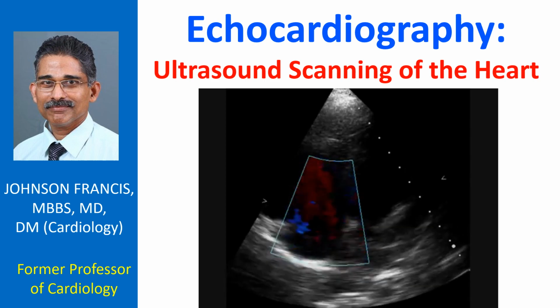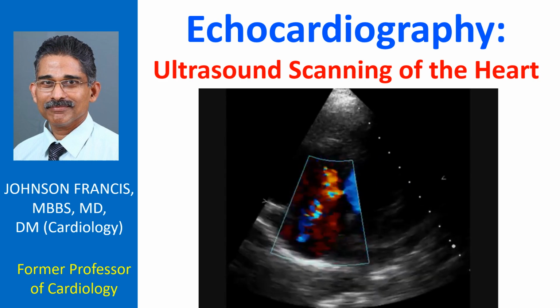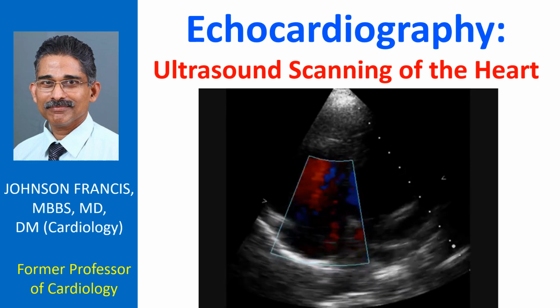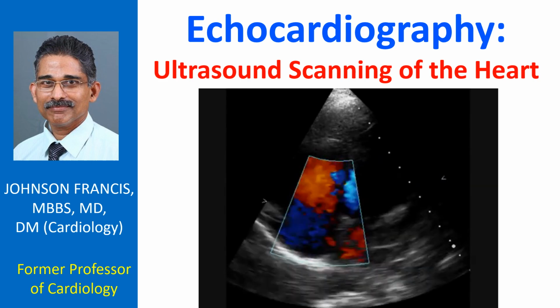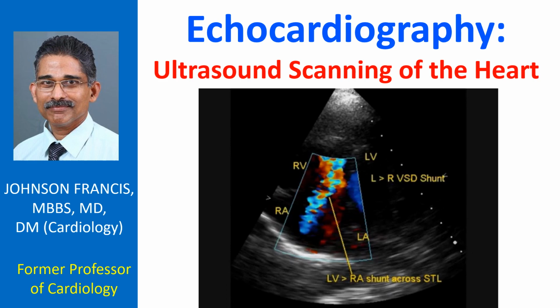Echocardiography, or ultrasound scanning of the heart, uses an ultrasound beam to scan the heart. The reflected ultrasound waves are analyzed by a computer program to give the images of the heart. The device used to transmit and receive the ultrasound beam is known as the transducer. It generates ultrasound waves using piezoelectric crystals which oscillate according to the radiofrequency electrical signals fed to them.